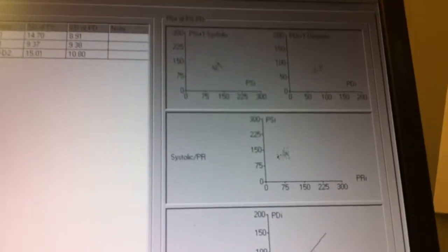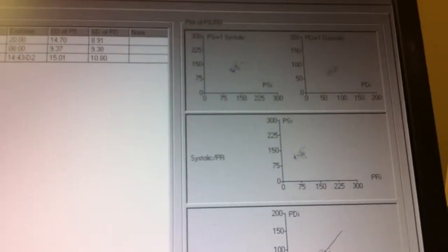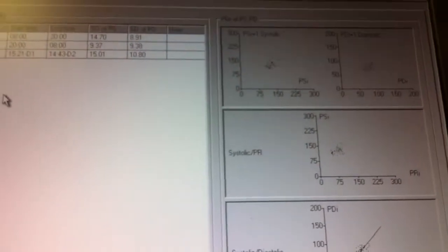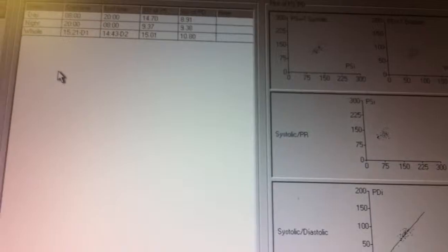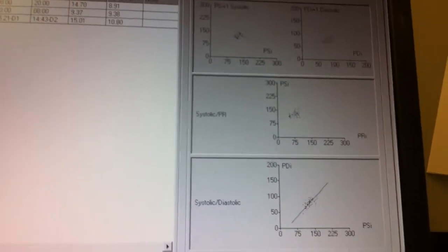There are also more advanced statistical analysis that the system accounts for, looking at Poincare plots, regression lines, and correlational coefficients. These can be evaluated more, so please refer to the operations manual for these functions.